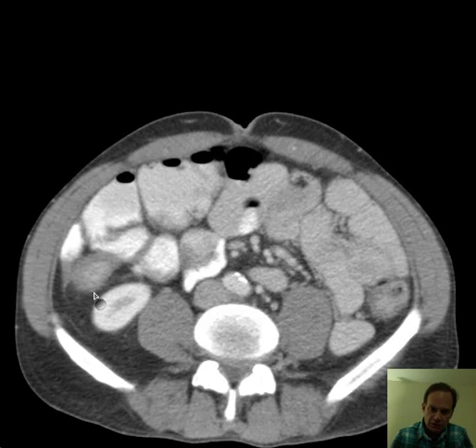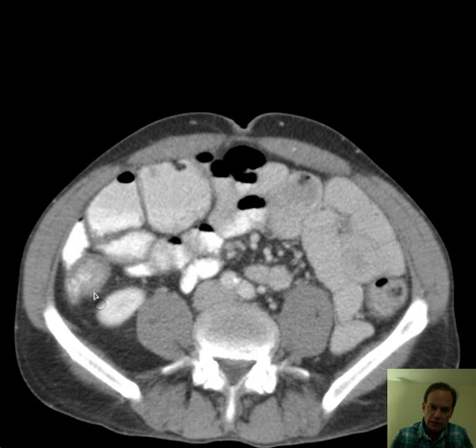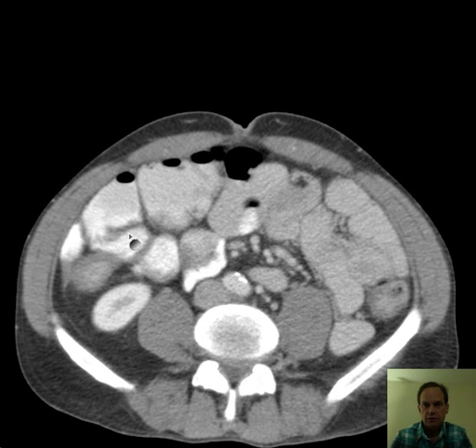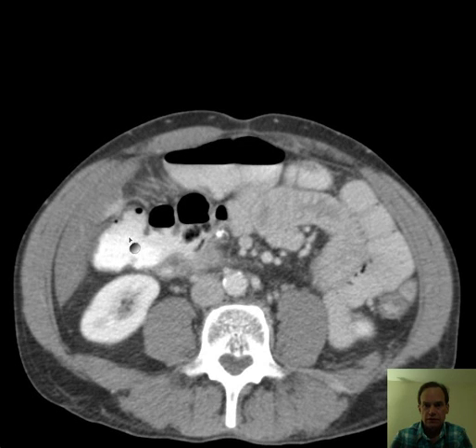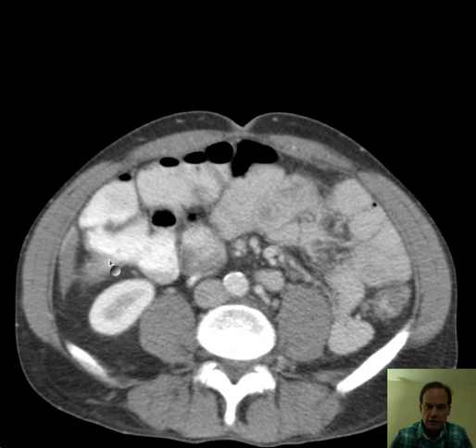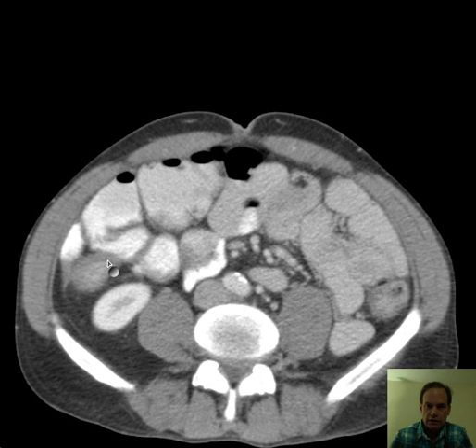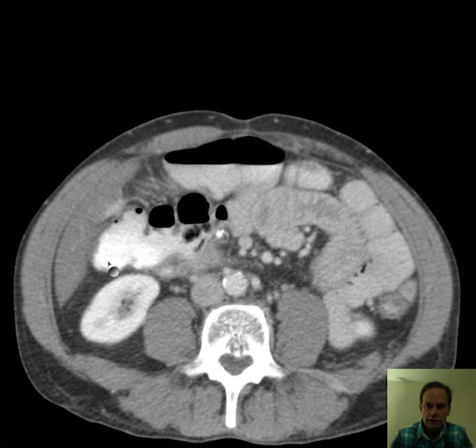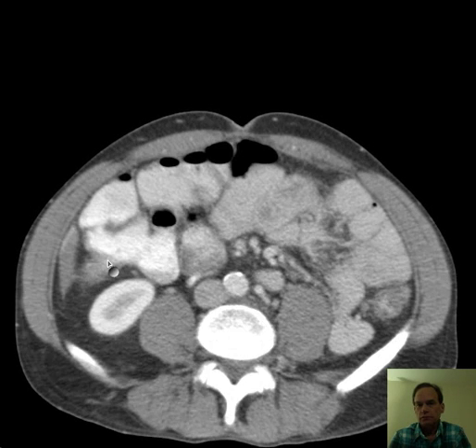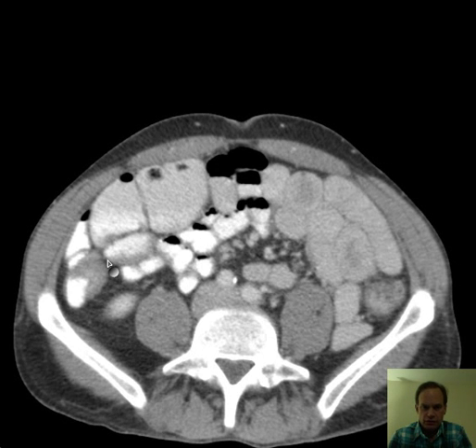And then we should be coming into the ileocecal valve. Well, this patient has a cecum that's up high, and there are a lot of variations of that. This cecum is quite high, but this is the ileocecal valve somewhere in there, right here. That is where it's emptying into the cecum and right colon. But I wasn't that impressed with that.